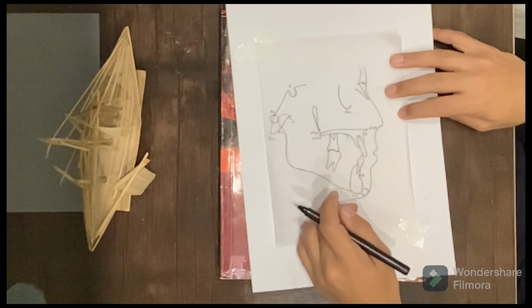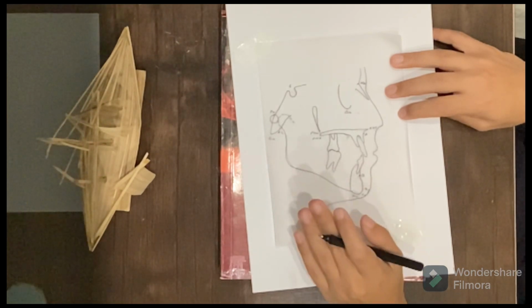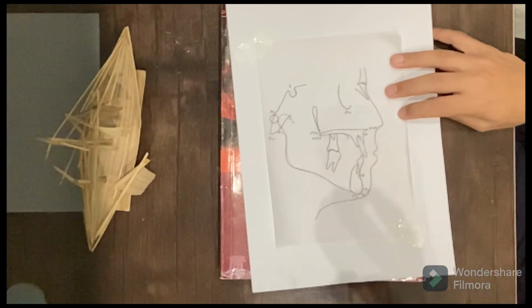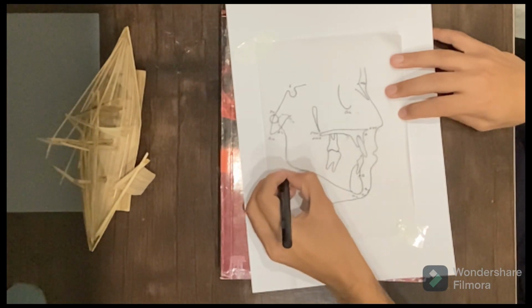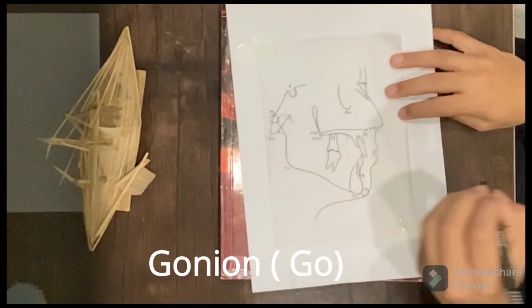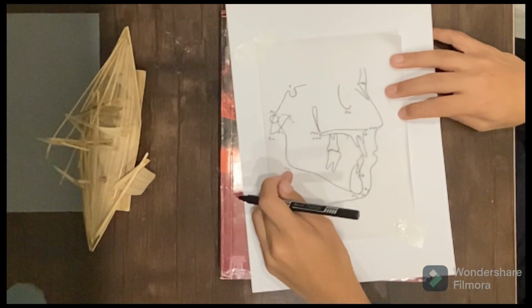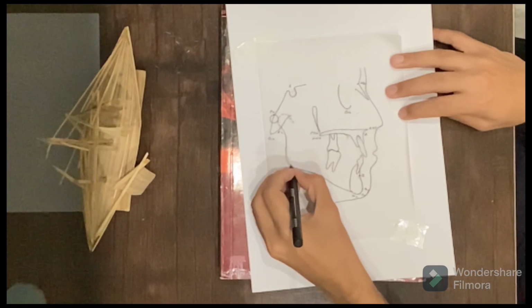So these are basically the unilateral points. Now we will discuss the bilateral points, which are present on the right and left side too, which is gonion. The gonion is present at the angle of the mandible. So the posterior and inferior point on the contour of the angle of the mandible is gonion. So this point marks the gonion.